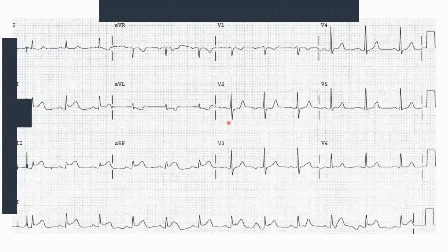Now, V1 and V2 sit directly across the back of the heart. So sometimes when you see these types of changes, in other words, V1 and V2 getting ST depressions, there's always a possibility of a posterior infarct as well. And leads V5, V6, AVL, 1, even V4, they also sit sort of across from it, but to a lesser extent. So sometimes you do also see these abnormal ST elevations and ST depressions.